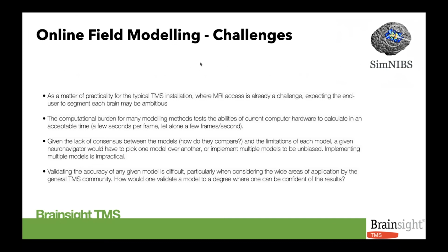So, we know already MRI access is not the most accessible for everyone. So expecting then a TMS user to segment each brain that they scan might be a big ask. The computational burden of doing that is hard work. To this day, we often still leave our laptops on overnight in the office, or a desktop running overnight. We come back and it's been segmented. That's getting better as computer hardware gets better, but it's still a long time.